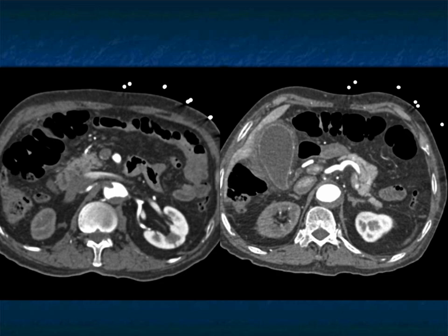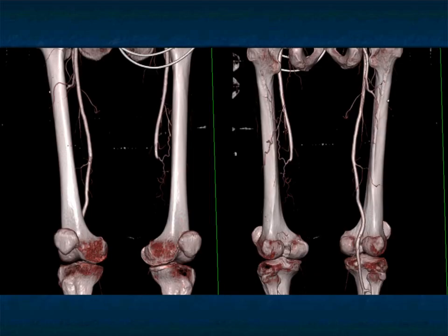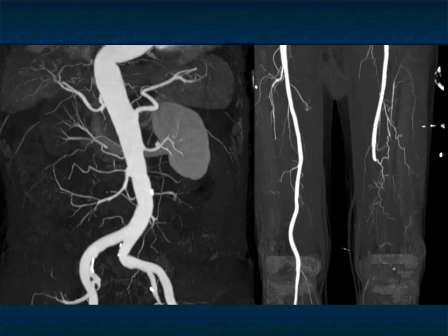There's occlusion and thrombus in the aorta and occlusion of portions of the right renal artery with decreased enhancement of the right renal artery. You also can see the patient showered emboli distally, occluding the patient's mid-SFA, very nicely shown on the CTA. And you can see nicely as we go to MIP, both the involvement of the right renal artery as well as the left SFA.